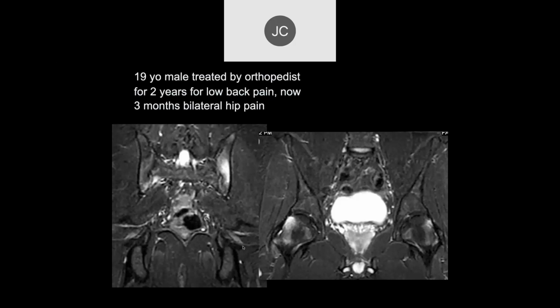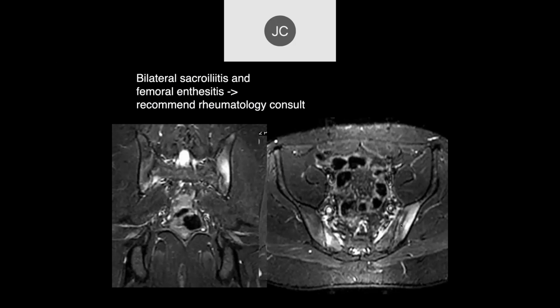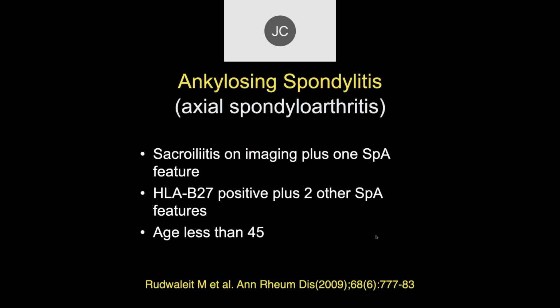Yeah. Bone edema on either side of the SI joints. Right worse than left. Bilateral sacroiliitis. We also have some inflammatory disease in the hips bilaterally. And there you can see the SI joint sacroiliitis. And he ended up having ankylosing spondylitis. This could be treated at a point where you want to treat it. And so I do have some more stuff on ankylosing spondylitis.